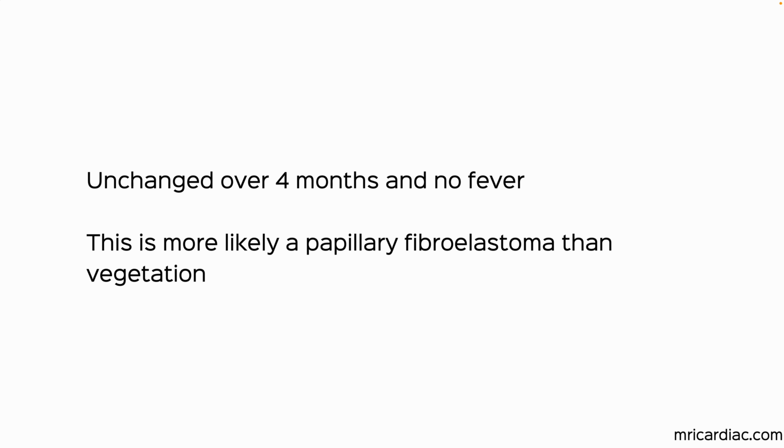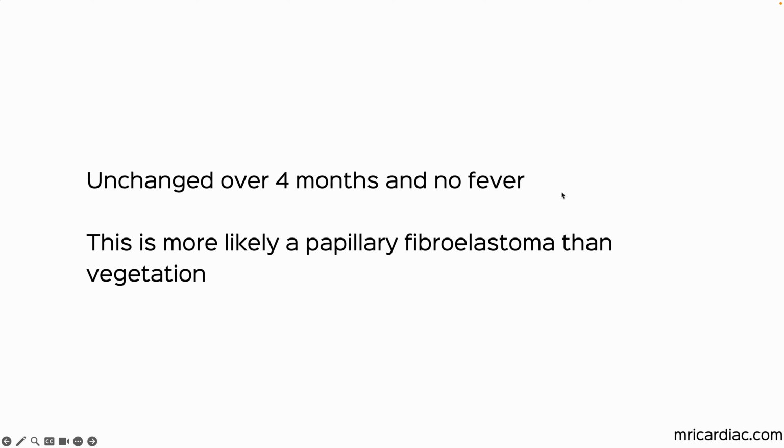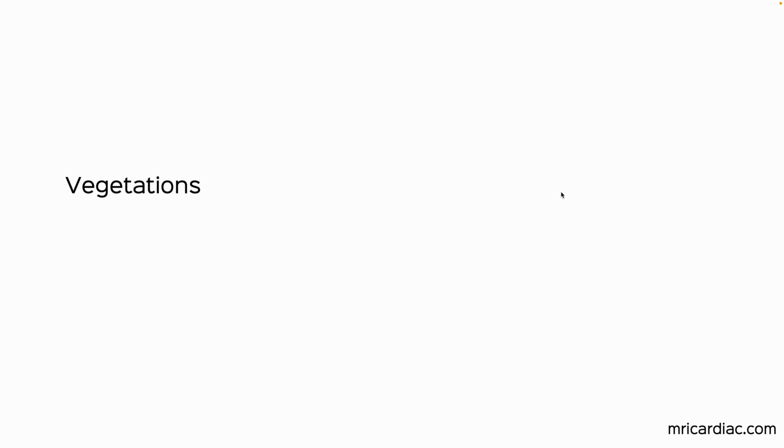And that is unusual for a vegetation. So this is more likely to be a papillary fibroelastoma. It's also downstream, and that again goes in favor of this tumor. And that's about vegetation.